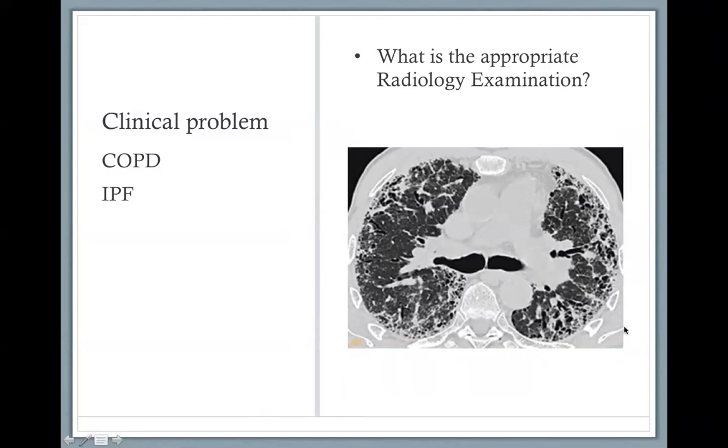So in the previous two cases, we have done X-rays and it was enough in the majority of times. Here, it's different. We started with an X-ray, but we know it's not enough and we did CT. The question: would you always do a chest X-ray and then go on if you need more investigation? So we always start with the least expensive, the most accessible modality, if it can answer the original question. In the case of pulmonary edema and pneumonia, it answers the question.